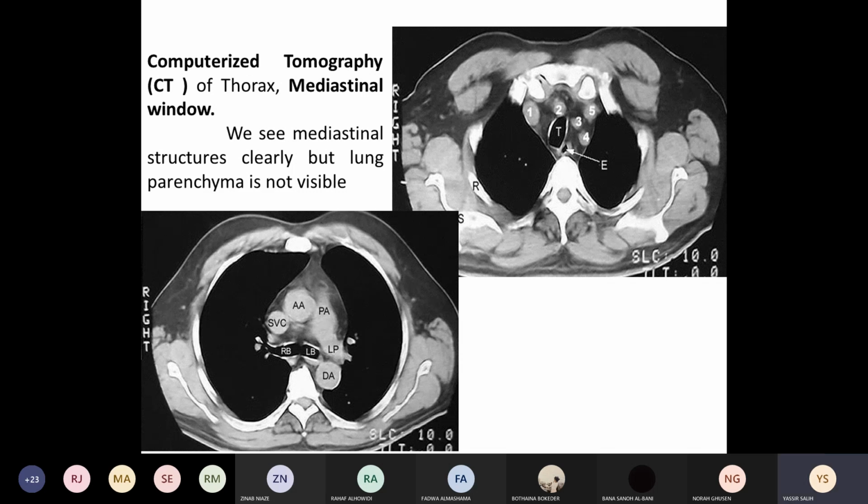من الآن تتذكروا إنه CT لأنها بتستخدم X-ray the bone. How to look to the bone. مثلا this is a sternum, this is a vertebra, this is a scapula, and these are ribs. CT, all this structure لأنه containing calcium appear very dense, bright.